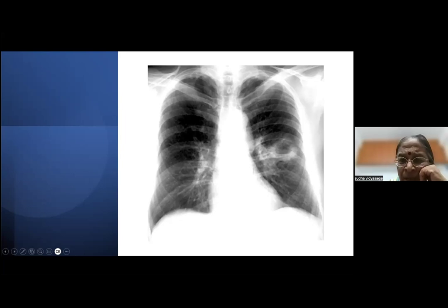So that's why, given the background, you have to go with the history of the patient. But remember that this could be anything. Could be a lung abscess, could be even tuberculosis, okay? But it's not a straightforward line like that. This could be a tuberculosis. Of course, it's not upper lobe. It could be lower lobe. It could be apical segment of the lower lobe. We don't know, right? And usually for a lung abscess, this is not the site, right?